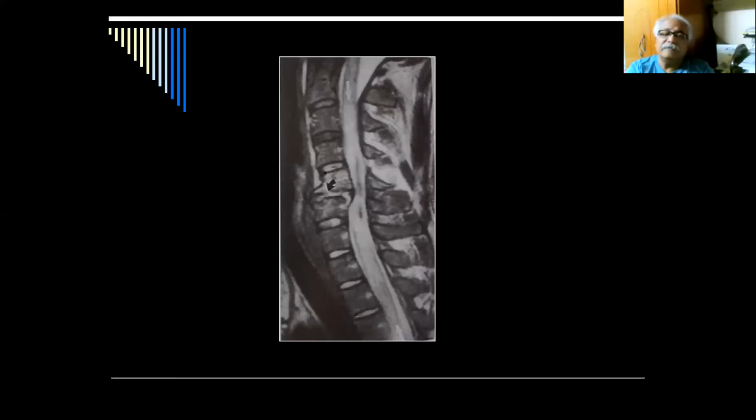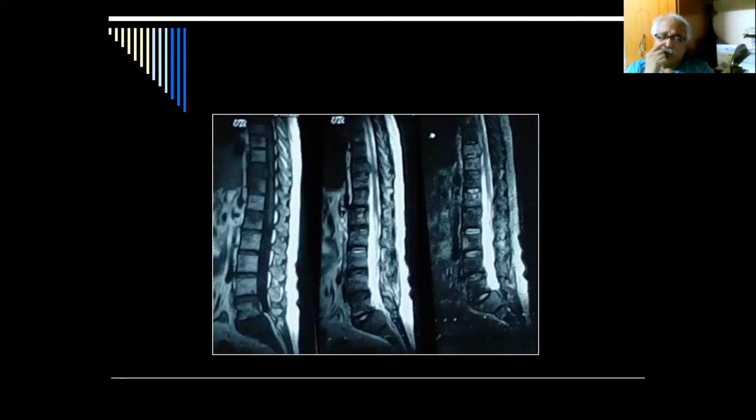Now you can see the vertebral body, there is osteophyte, there is disc, and also there is some retrolisthesis. The disc is there and the body has gone back. So whenever you see this sort of picture, you have to be very cautious, because if you understand the basic pathology, the basic reading of the MRI of the knee and shoulder, reading the spinal MRI becomes very easy.